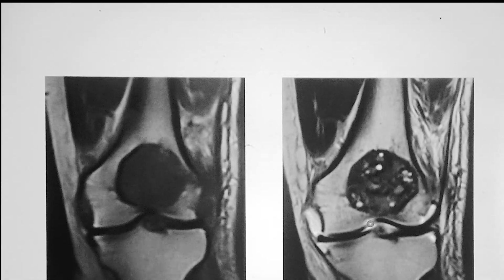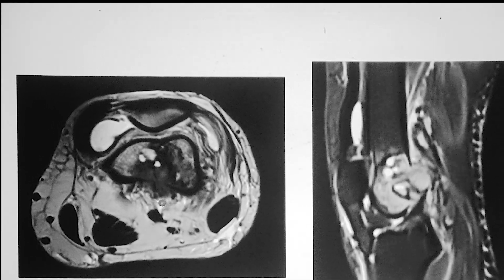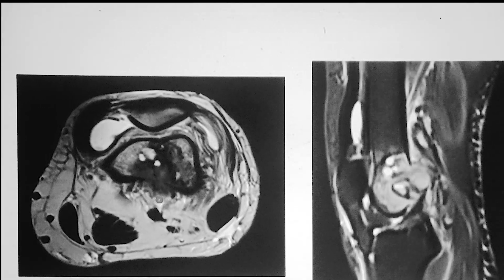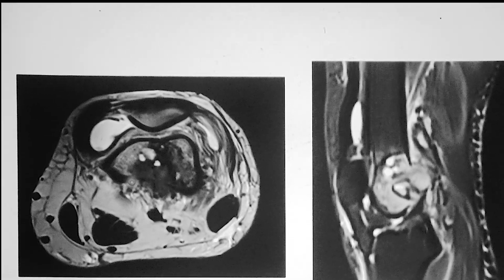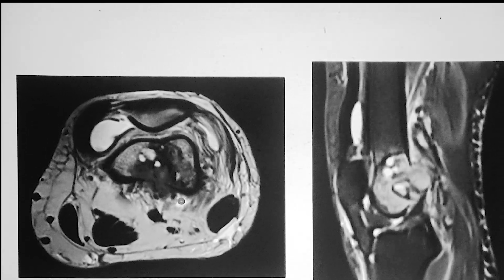Here we can see there is a cystic component. Is it necrotic? A few cystic components with septations. What about the signal? Does it look like a necrotic or solid component? On T2 there are a lot of fibers, hyperintense, with cystic areas in the epiphyseal region. So is it more fluid component or just fibrous component?